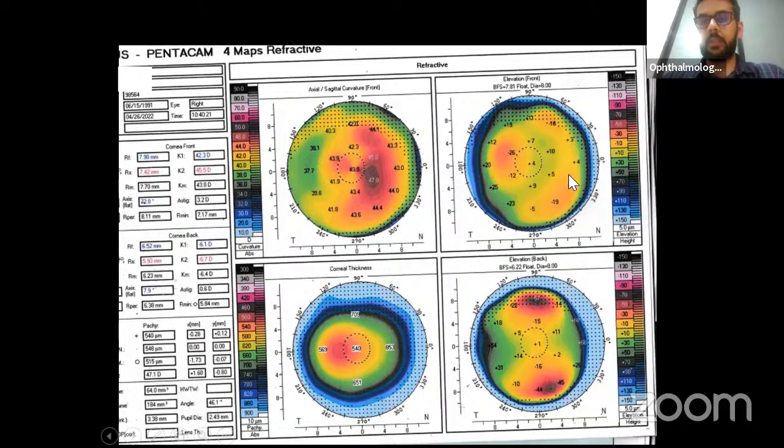If we compare the points that we discussed after dividing the cornea into halves vertically, it is minus 26 microns of depression at the temporal side, and +10 microns of elevation on the nasal aspect, which is okay.